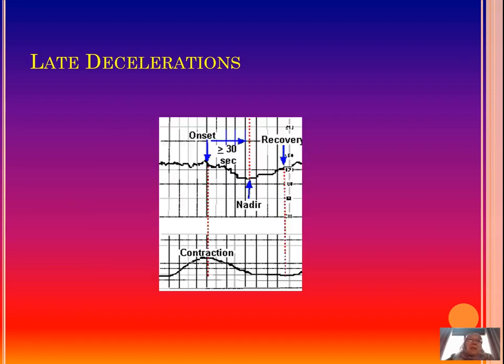Late decelerations, on the other hand, usually start at the top of the contraction, when the contraction is the strongest, and then the deceleration occurs, and then it takes a long time to come back to the baseline, to normal, after the contraction. These are a pathological feature that is worrying, and that shows that the baby has got a reduced fetal reserve and cannot compensate very well with the contractions.